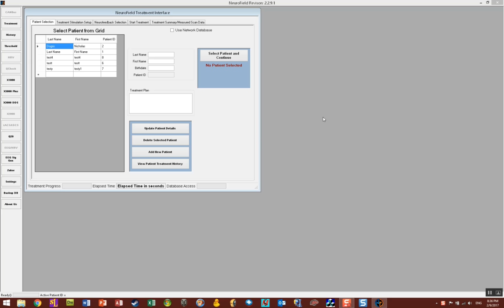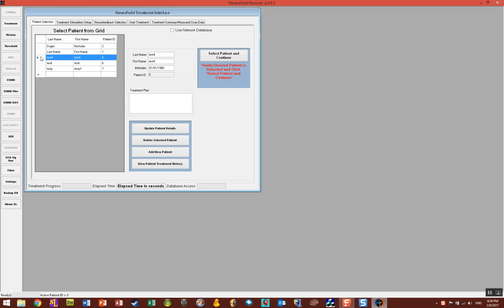In this video, I'm going to show you how to use the tDCS, tACS, tRNS units in manual mode in NeuroField64. Okay, so I've loaded up my program here. I have two tDCS units connected along with two X3000s and a Q20.